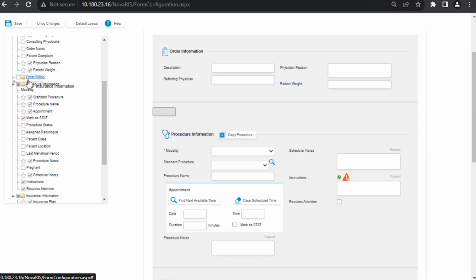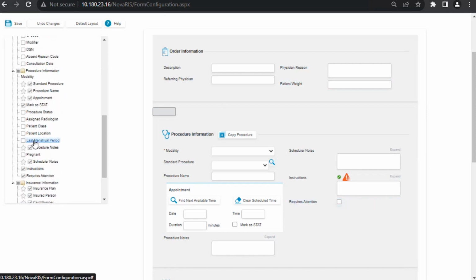So now that I have that one here, you can see my sections will change order. So that is one of the things that you can do when you are changing. And again, you can add more fields and others.